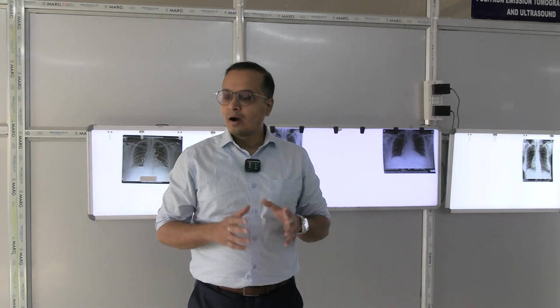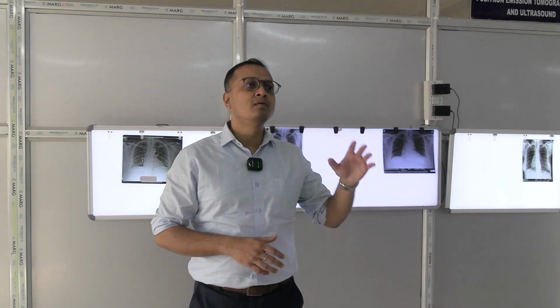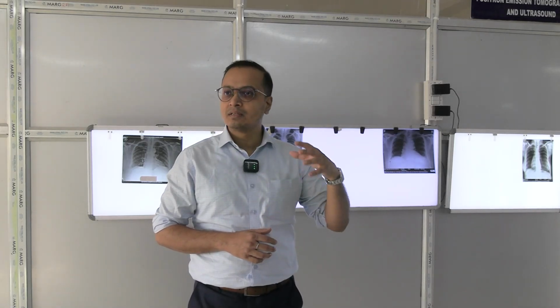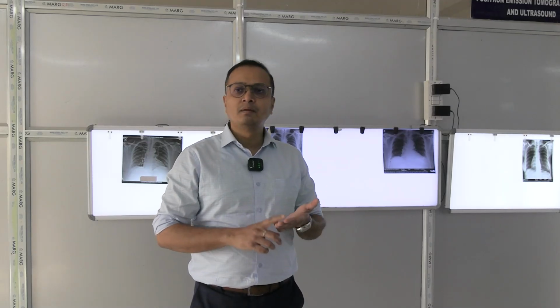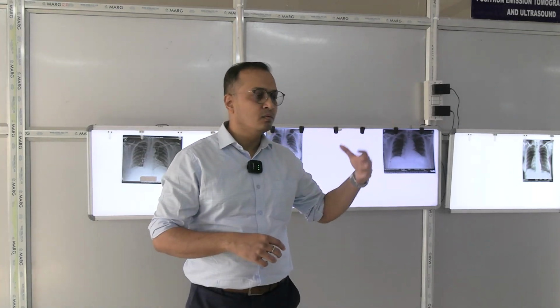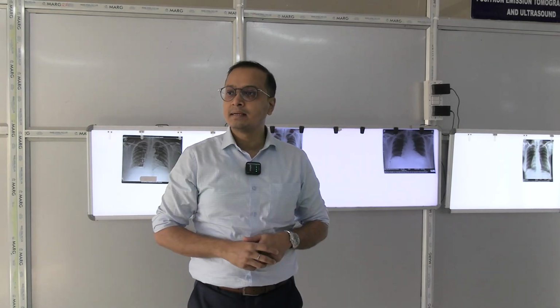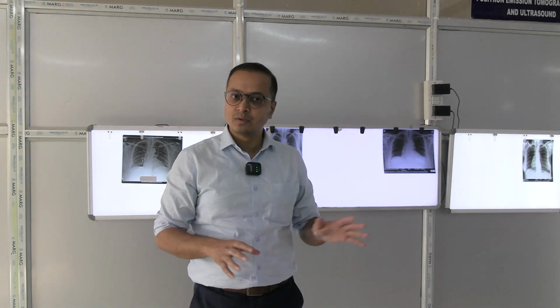So, how are you going to say that this is a general or normal X-ray plate versus a special X-ray? Whether you are seeing something special or not makes this particular X-ray plate a special X-ray plate. Normally we take the silhouette or impressions of bones, soft tissue structures, etc. So, we cannot see the blood vessels, or the inside of the lumen of the intestine, or anything related to veins. If those things are visible in an X-ray plate, that makes it a special X-ray plate. Otherwise, we consider it a plain X-ray plate, which is what we are going to address.